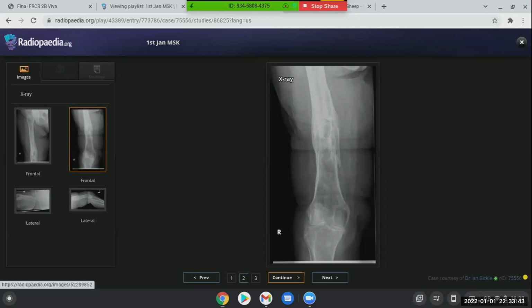Okay. So which osteomyelitis do you think in this? Acute osteomyelitis or chronic osteomyelitis? The case is discharging right now, and we have sclerotic changes. So I suggest this is a chronic osteomyelitis case based on the expansion of the bone and the sclerotic changes. And so I think this is a chronic osteomyelitis.